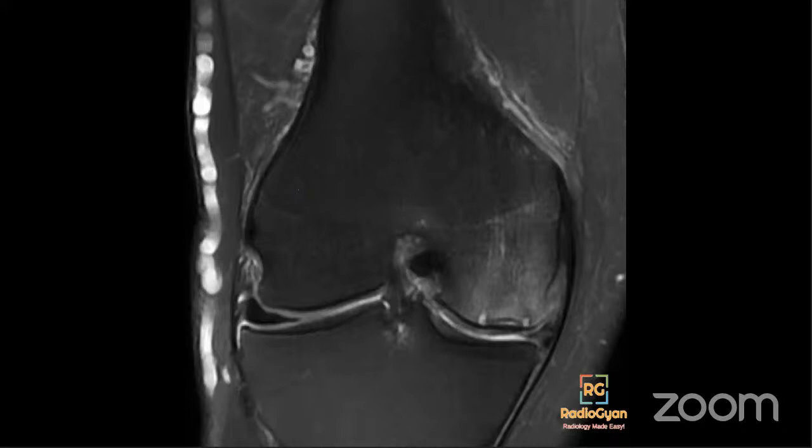Okay, I was expecting this answer, and I'm glad that somebody has called it a SONK. And I assume by that you mean to say that it's a spontaneous osteonecrosis of the knee. So this is the reason that I wanted to show this case. Earlier, this pathology was known as spontaneous osteonecrosis of the knee. Before that, I'll just describe the findings for those who have not been able to pick up.